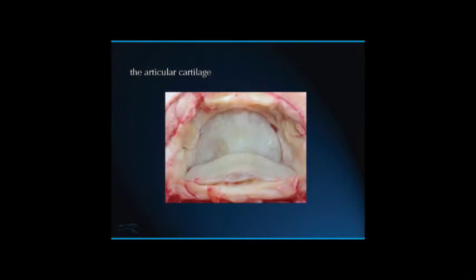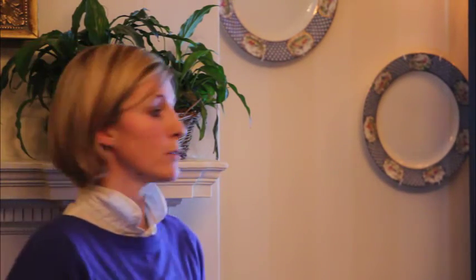The downside is that there are some cases which, even though this is a horse with quite bad articular cartilage, some cases can be hard to detect. So if you've got a large horse that won't stand very well, you can often get the appearance of absolutely normal cartilage because you can see the layers, and this type of pathology can be going on and you will have no idea about it. And these horses don't always block very quickly anyway to a coffin joint block. So we have been caught out a number of times with quite advanced cartilage disease with relatively normal looking MRI findings. So that is a differential diagnosis for a normal MRI scan in a horse that blocks to that region.